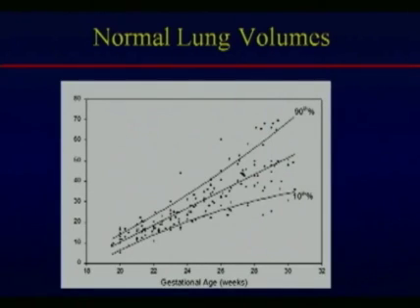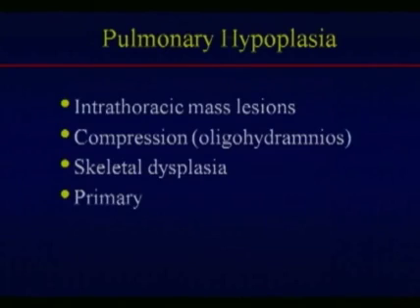Again, we can also look at it in different ways, and there's using 3D volumes, either with ultrasound or MRI. We have good standards in looking at overall lung volumes with gestational age, and not surprisingly, and as expected, the lung volumes continue to grow throughout pregnancy.